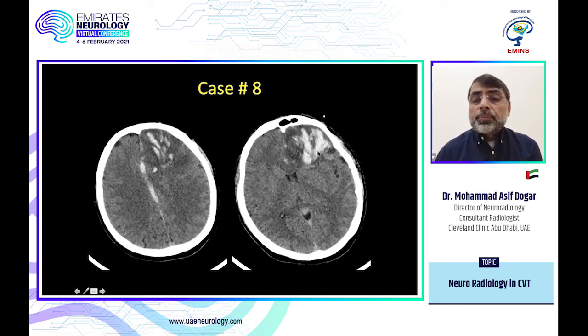Again, you can see typical venous infarct-like hemorrhage, laminated, interrupted hemorrhages. In this case, the cortical veins were okay, the superior sagittal sinus was okay, but still this pattern is worrisome. So if you have this kind of pattern, look hard for any other vein which is thrombosed.